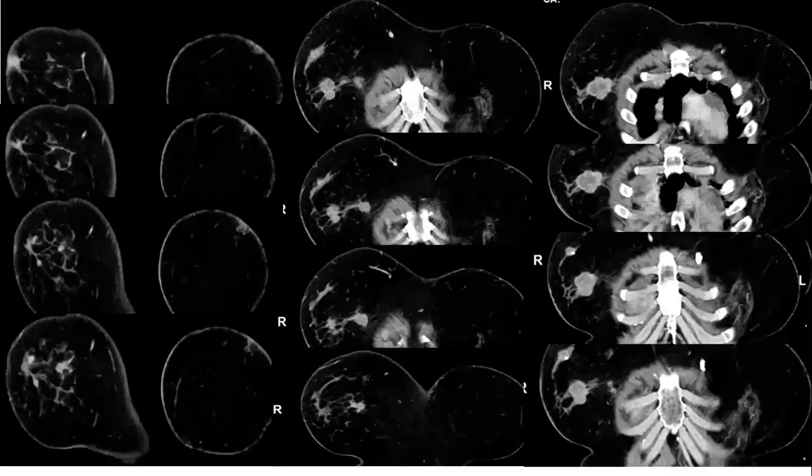Okay, this also we can use the multiplanar CT for local staging. Here, can you see the nipple enhancement and how the adjacent nodule is extending? This is an enhancing duct. That is the same duct from this satellite nodule extending into the nipple with enhancement, which makes it more suspicious for nipple involvement. And these multiple satellite nodules are interconnecting.